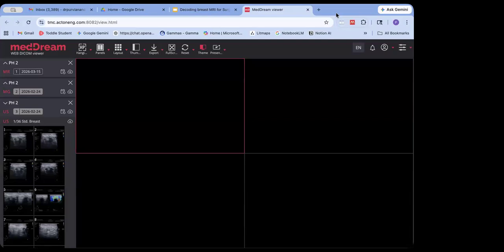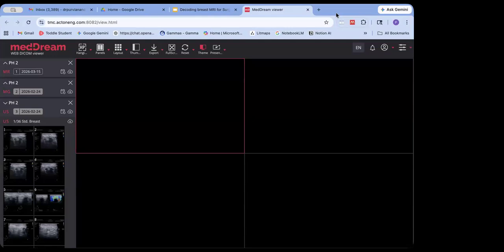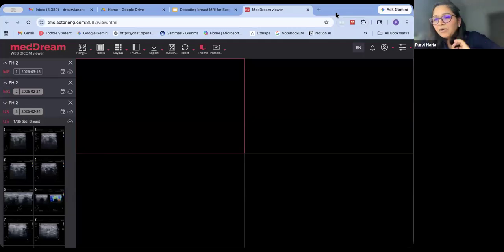Okay. And you basically expect to see segmental non-mass enhancement primarily in DCIS, and in which sequence or phase are you going to look for it? In the contrast, the ultrafast or dynamic contrast, wherever you see that segmental appearance. The important thing is you need to differentiate it from BPE, background parenchymal enhancement, because this is non-mass. You will not see any correlate on T1 T2 weighted images. You will just see this enhancement on your post contrast subtracted images.